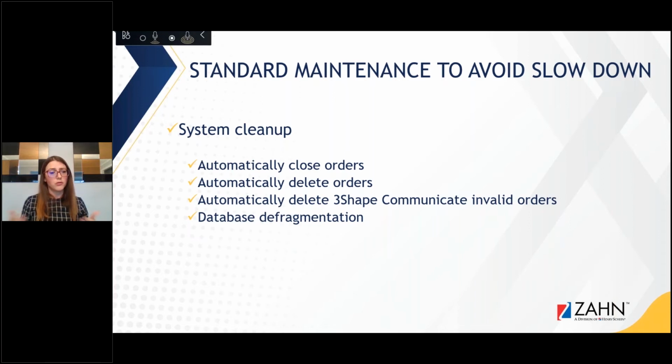However, if you do want to do both cleanups, you can tell 3Shape in Control Panel to delete the cases as well. You just have to remember to move them, or you can work with your IT and they can actually automate that process for you as well, where all the files are automatically moved once a month, once a week, whatever you decide, into a separate location so that they're not lost. The case information is not lost. And you can always re-import this case into 3Shape.